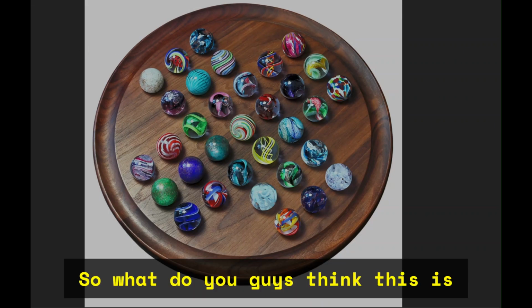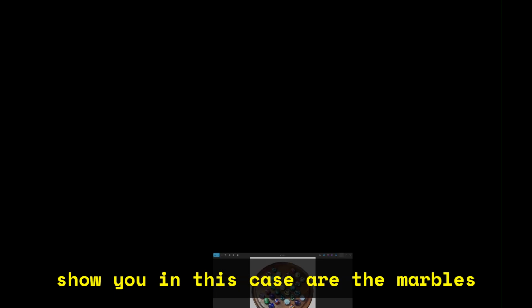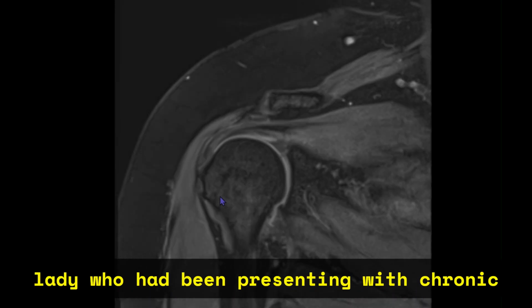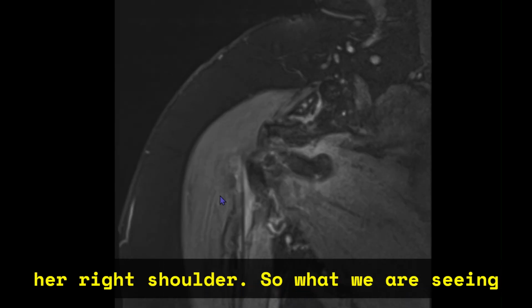So, what do you guys think this is? These are the marbles, and what I'll show you in this case is the marbles which are seen in MRI shoulder. So, this is a scan of a 50-year-old lady who had been presenting with chronic increasing swelling and severe pain in her right shoulder.